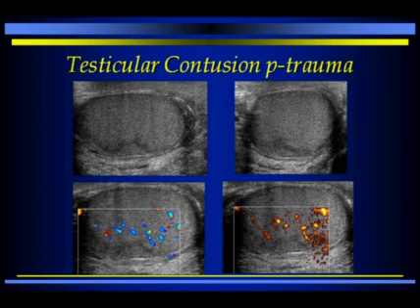Moving on with the post-traumatic findings that one can see in a testicle. So, long view, short axis view of a testicle. Post-trauma, we see here that the surface of the testicle is still smooth because there's an intact tunica albuginea, but there is an unusual sort of mass-occupying lesion here, and this is a contusion of the testis. In the appropriate clinical setting, a young boy just played football, got hit in the testis, this is obviously going to be a contusion.